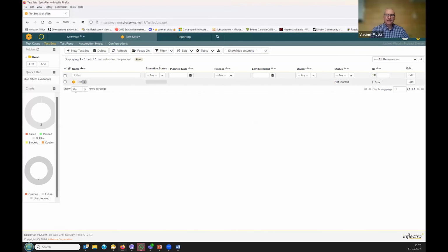So there you go. This is your test set created with two requirements. So yes, at each level of the V, you can generate your test cases and generate your test runs for those levels. Exactly. Thanks, Vlad, for running it right away.